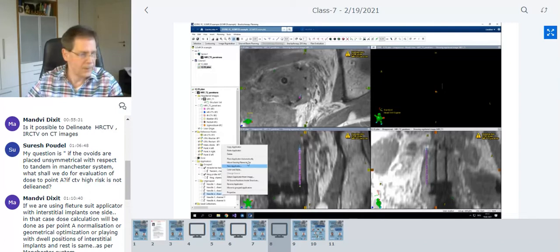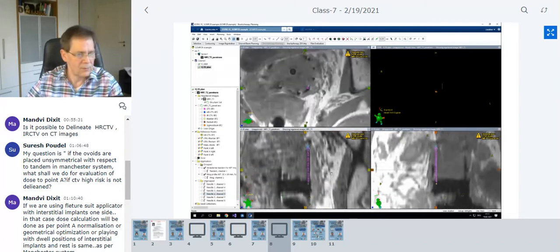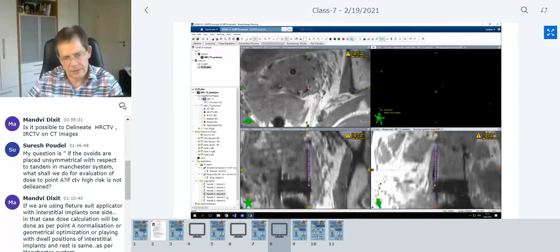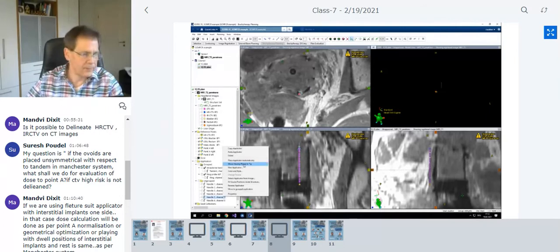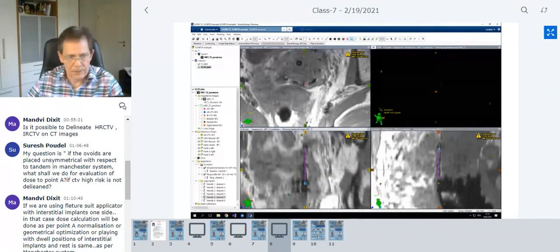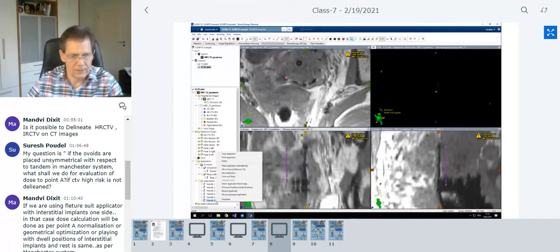And I can already go to the next needle and move also the viewing planes to the tip and activate this contour editor to place the needle where I see the tip. And check this in the sagittal view. This is a little bit tilted. Two other needles to go. So here's the tip a little bit lower. That looks good. So let's look in the other plane. Needs a bit of tilt in this direction. And needle number 6.